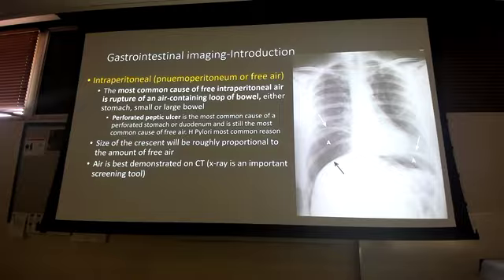You could have a diverticulum that perforated, right, and it's still going to cause the same type of thing of free air under the diaphragm. Yeah, air is best demonstrated on CT. Everything's best demonstrated on CT. But an X-ray is enough to be able to diagnose this if it's bad.